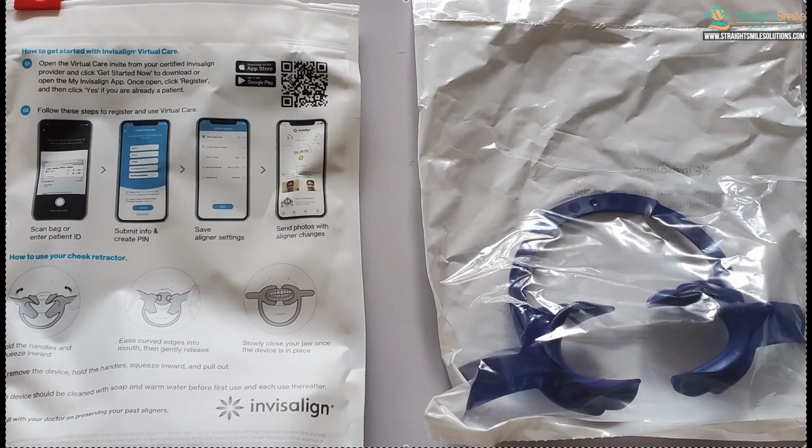But honestly, what you're getting here: on one hand, the use of the Virtual Care app is free, as long as you're an Invisalign patient. So that's good. And the pictures sync right into your portal, which is HIPAA compliant. And then you'll get a notification when they check in on the regular frequency. So you can go into their dashboard, into your Invisalign account, and check it.